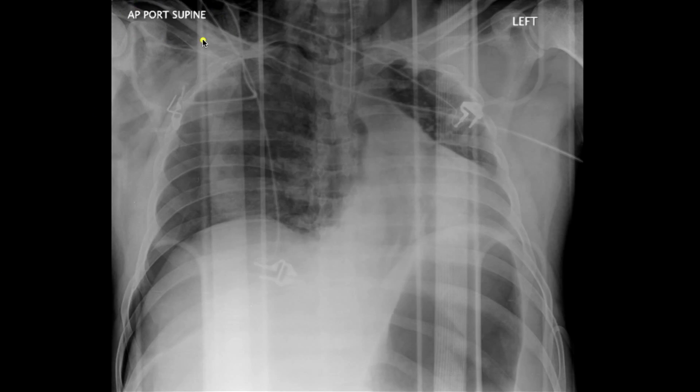In this example, this patient is again a trauma patient. You can see they're taken in a supine position on a trauma board. When we're looking around the margins of the field, I'm going to start here and extend down here. Can you see, compared to the other side, that you've got a lot of lucency here? This is air rising up and filling the anterior costophrenic recess, and this is called a deep sulcus sign. You can see that there's gas extending right down into the costophrenic recess.